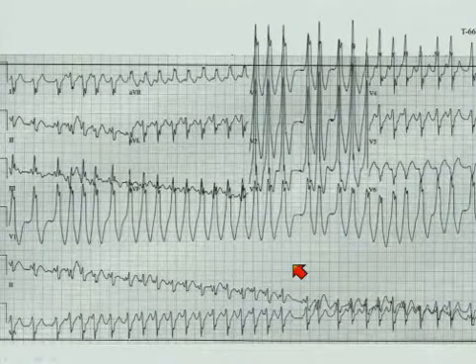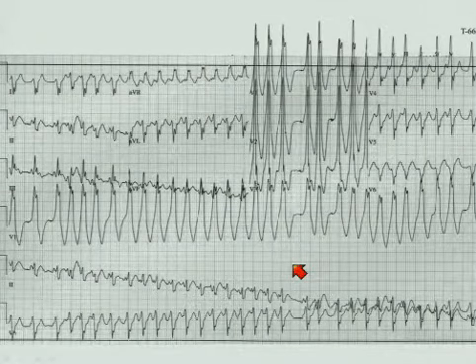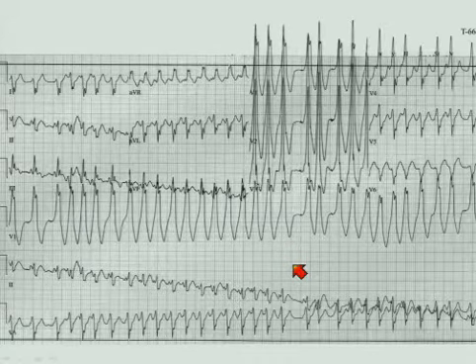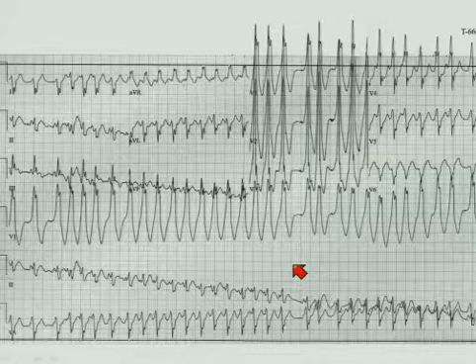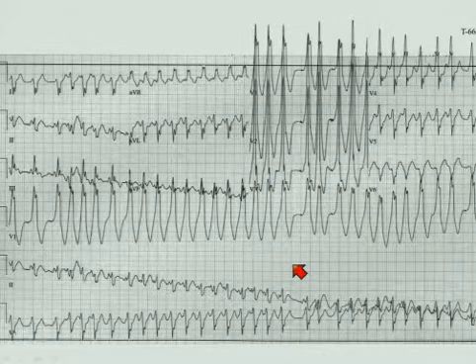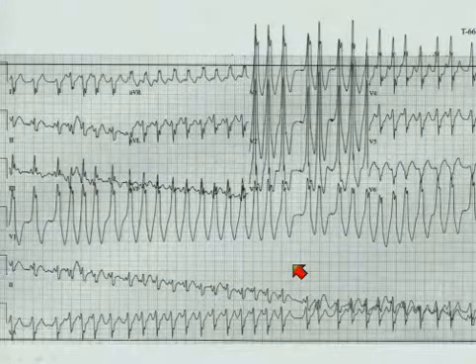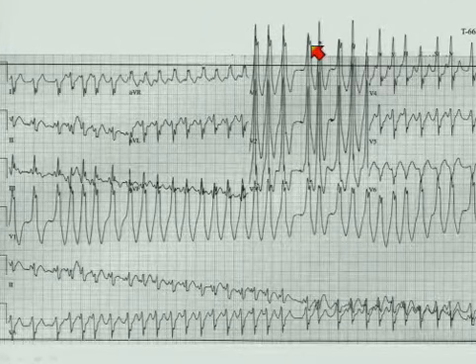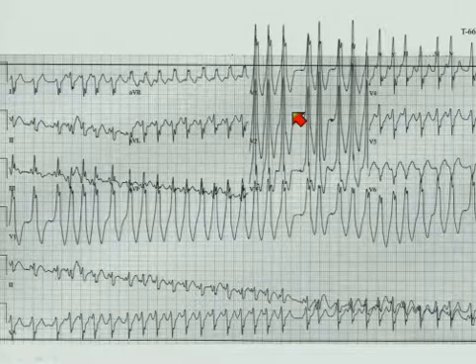And then this one, you'll all recognize immediately. This is WPW with atrial fibrillation. And I just put it in there to make this point. All those morphology rules go out the window when you're dealing with WPW. This has the initial R greater than the second R. The WPW patterns can simulate many.